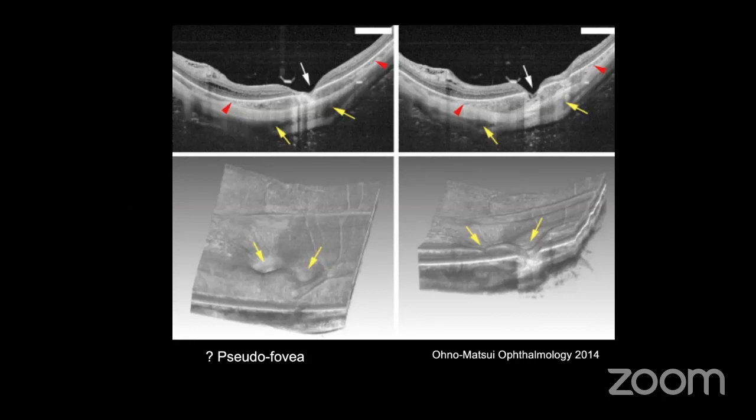It's thought that there is a direct communication between the vitreous and the intrachoroidal cavitation in some eyes, very similar to the peripapillary change. Occasionally, we may see adjacent retinoschisis, and sometimes clinically, or sometimes in 3D OCT scans, it may mimic what we call pseudofovea.